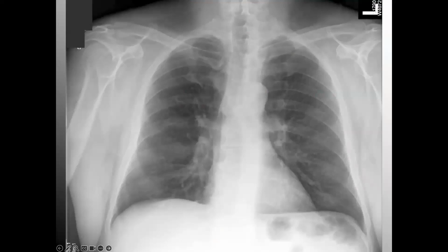All right, let's get warmed up a bit to do some practice. So take a moment. What type of chest X-ray are we viewing here? Is it a PA, posterior anterior, or is it an AP, anterior posterior? Now, probably it's a PA X-ray. There's no scapular shadows. There's no perfect scapular shadow border line here, as we'll see coming up in some other X-rays. And likely this would be considered normal.